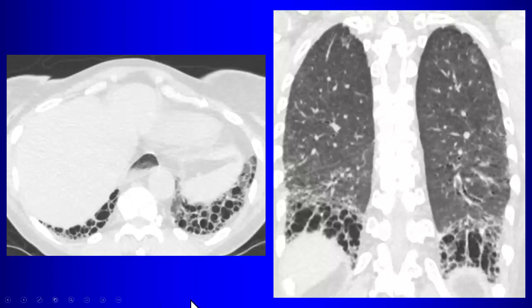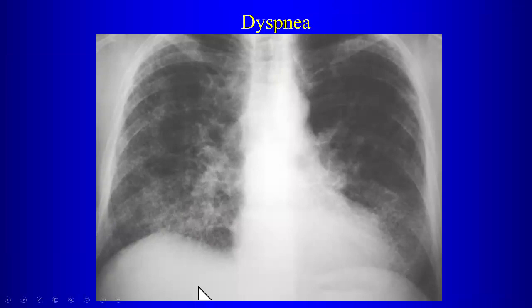So we'll talk later on about whether there are ways to differentiate honeycombing from scleroderma versus honeycombing from idiopathic pulmonary fibrosis or UIP. But on the boards, it's a favorite case to show you interstitial disease, honeycombing. You have to notice the dilated esophagus, and then that's what should make you suggest scleroderma, underlying connective tissue disease, as the abnormality.